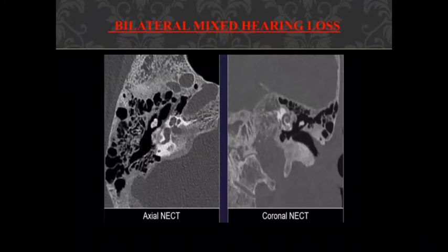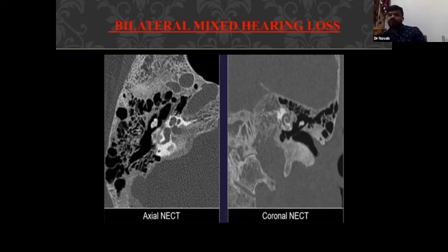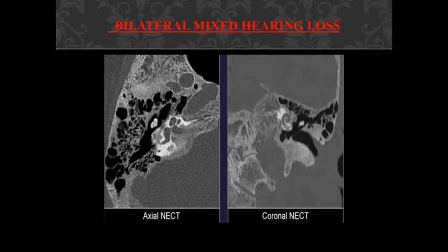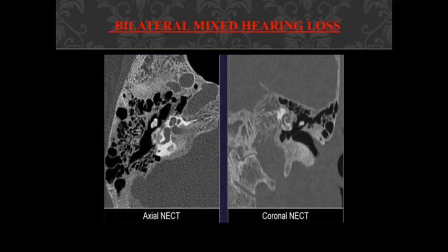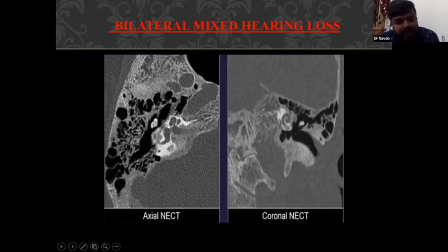There is a destruction of bone. That means it is only destruction or sclerosis? Both are there, right? Both are, sclerotic and lytic. Then why is this cochlear region spared? You can see some demineralization around the otic capsule also. You can see that in this area. This is not much. Okay.